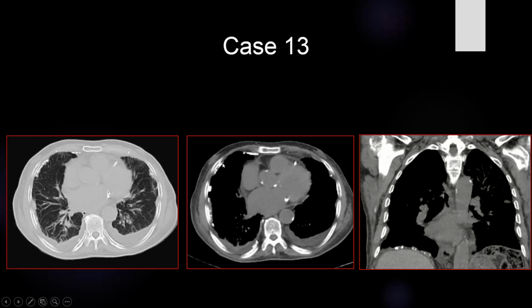Asbestosis usually causes calcification of the pleura, especially involving the diaphragmatic reflection, and it may be associated with pleural effusion. If there is affection of the pleura only, this is called asbestos pleural related diseases. If there is a lung affection, this is asbestosis.